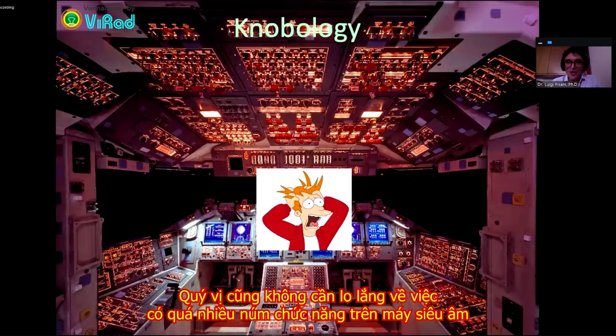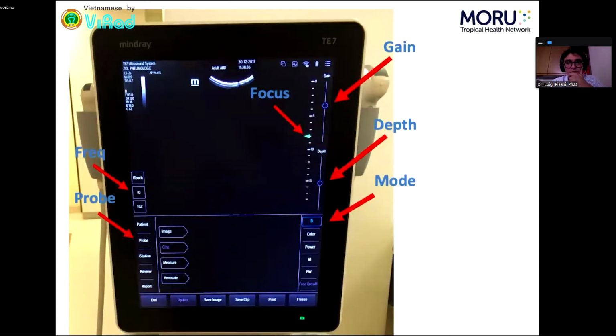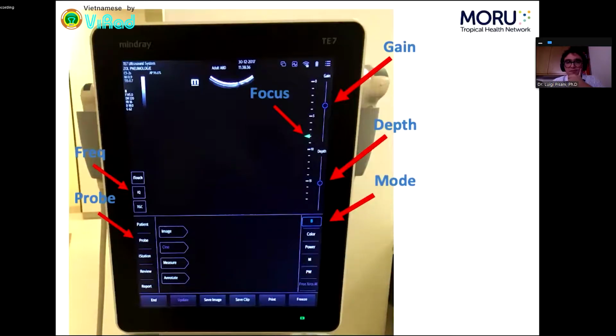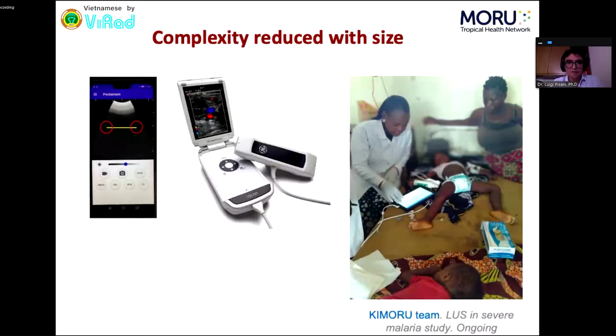Don't worry about knobs too much. We only have few knobs to regulate in lung ultrasound. The most important are the gain, the depth, and the frequency. The size of the machines is getting smaller and smaller, and so they are getting simpler and simpler.